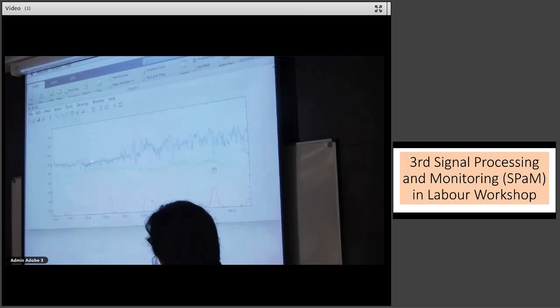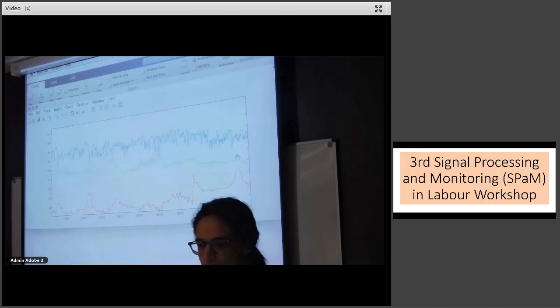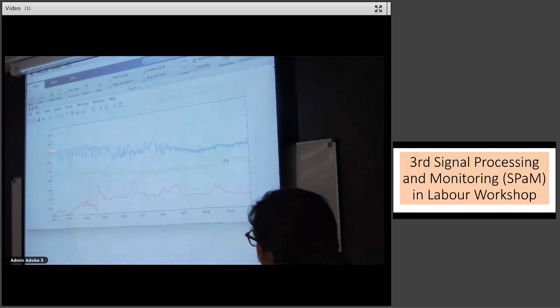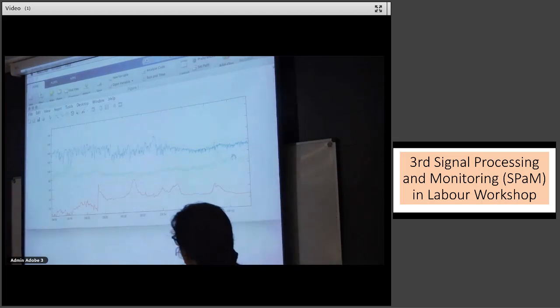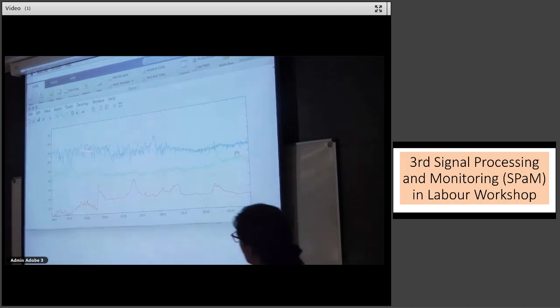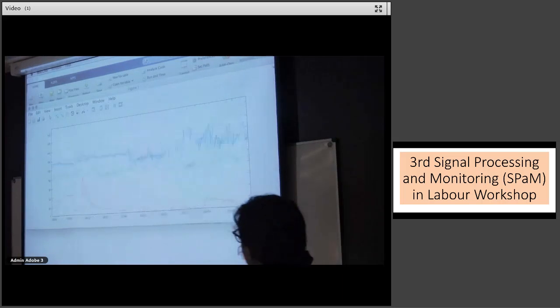So baseline 120, 115, 120, according to gestational age. Right. And these are accelerations. Most of it is cyclic. So baby is cycling, which I think is very reassuring. Baby was cycling. That was a reassuring pattern. So let's stop here.